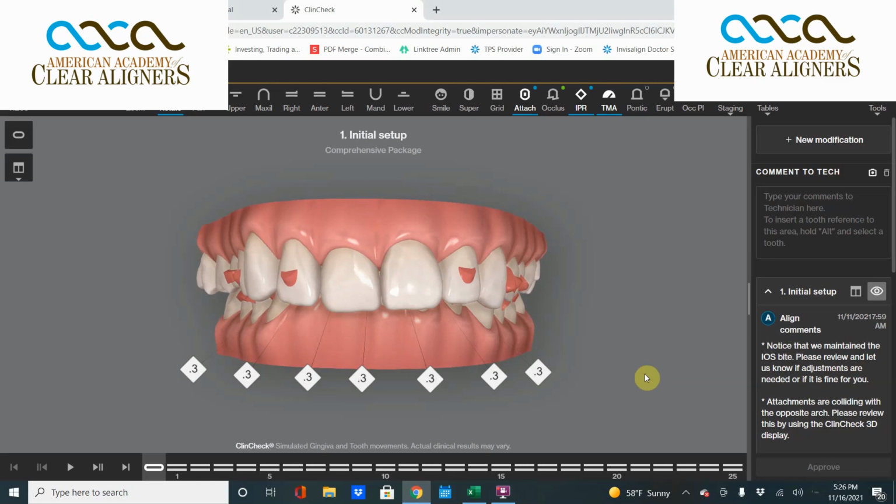Today, this is probably one of the most complicated ClinCheck theory concepts I'm going to teach you. It has to relate to GLR 3.0 and a slight glitch. You might understand this, you might not, but I'm going to give it a shot anyway.